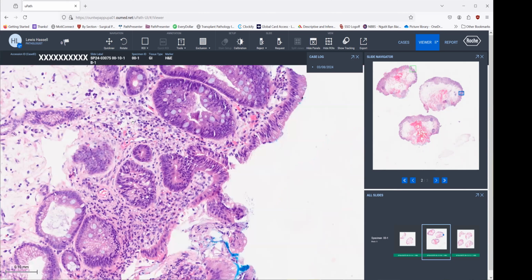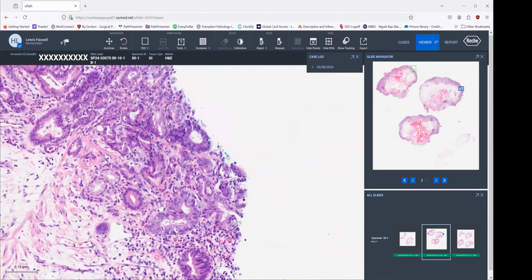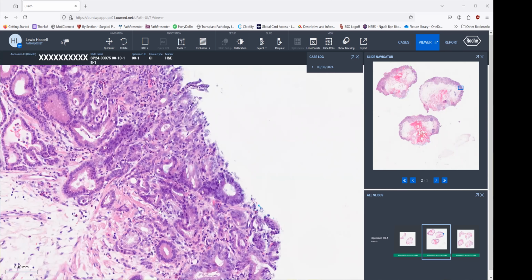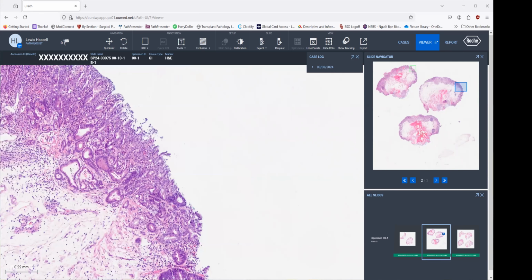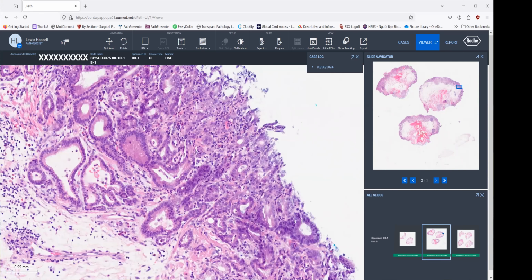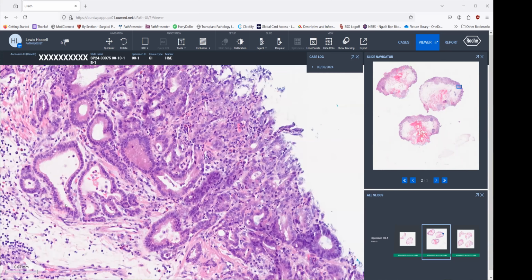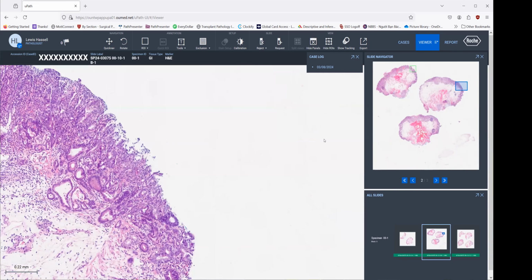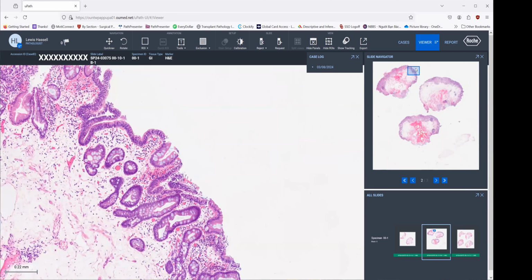But then right here next door, we see abnormal architecture. The glands are closely packed. This would be best termed intramucosal carcinoma. And in fact, here you see these, again, glands sort of drifting downwards, probably below the smooth muscle here as the beginnings of invasion. So this is quite instructive. Let's take a look here. I've got one more teaching spot over here to highlight.